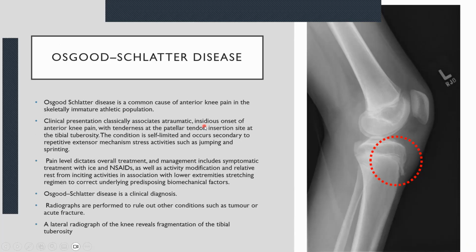This is a nice one, and I know one doctor who will see this and who will immediately recognize it, who's also on the group. He recently had a patient like this, and he's in partnership with a much older doctor who actually taught him about this. So, he'll be happy to see this as well.